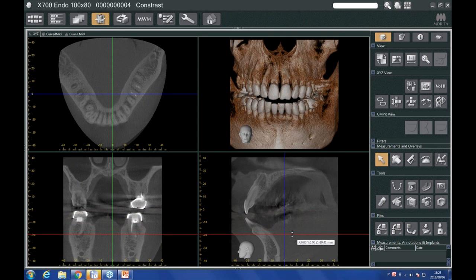So working on the mandible, if I'm going to do a presentation, say for example for the patient or for the insurance companies, I can use the printing software within our Idixel imaging suite to give a radiological report on this particular volume. In many cases, we need that for insurance, or we need to do that to explain to the government why we took a particular volume.